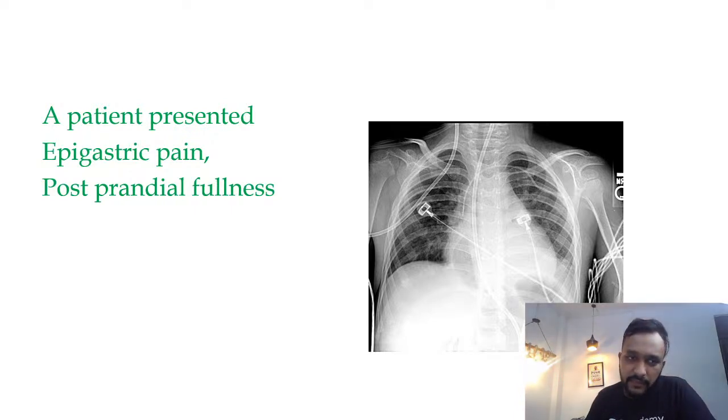A patient presented with epigastric pain, postprandial fullness. Can anyone help me with your diagnosis for this case?